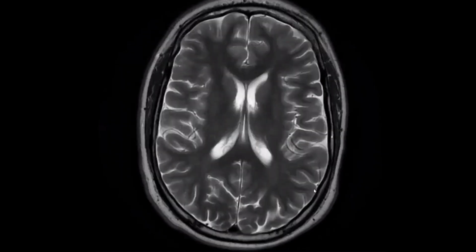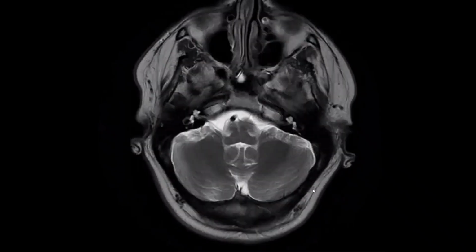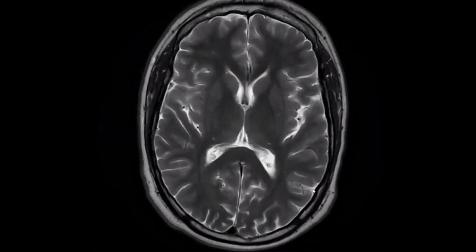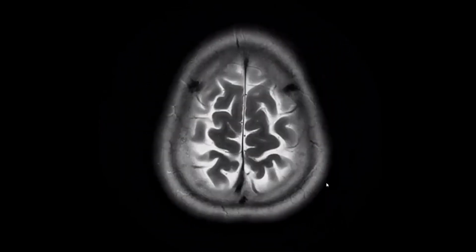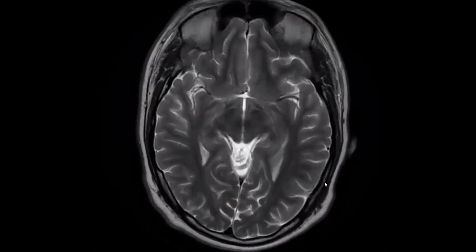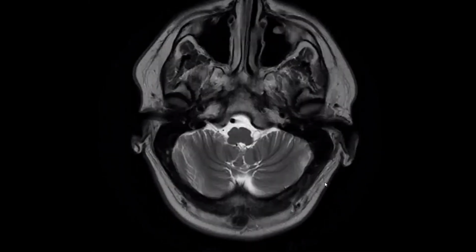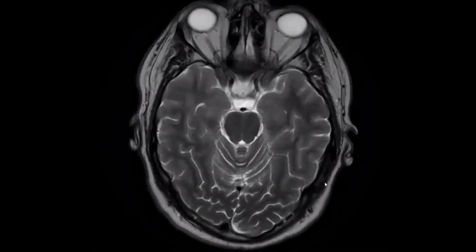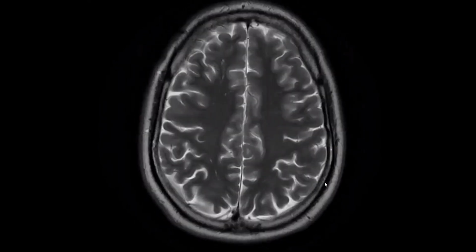This is a 25-year-old young adult patient complaining of epilepsy. Okay, so I'm presented with MRI brain axial sections, T2-weighted images of a 25-year-old patient. First, I would like to have a look, then I will start describing my findings.